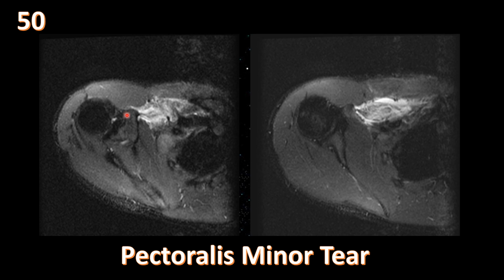But also it helps that there's a young football player that had a pop or heard a pop and pain when he was pushing another player. So pectoralis minor tear.